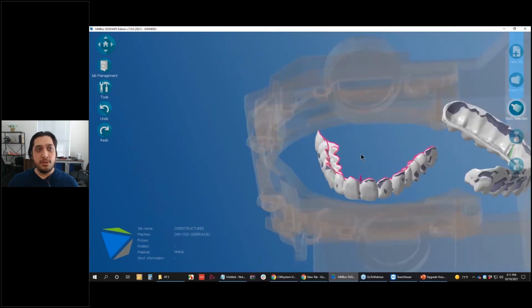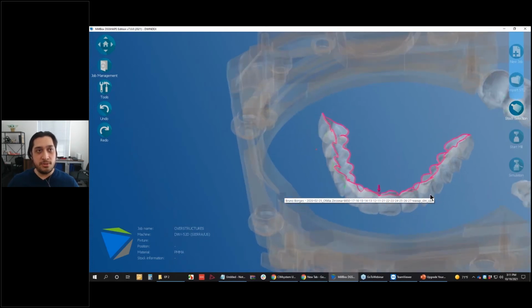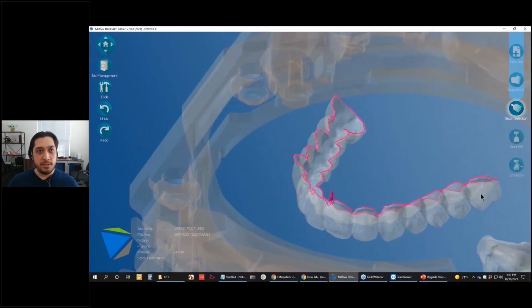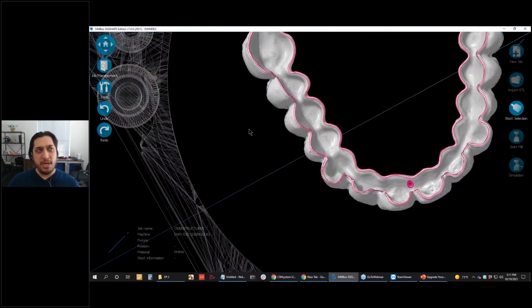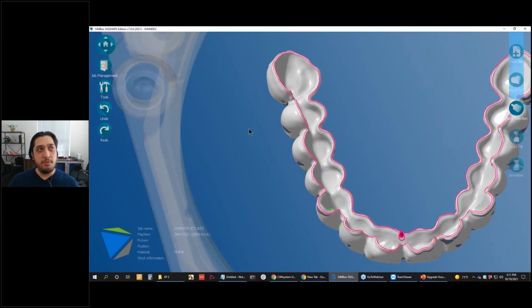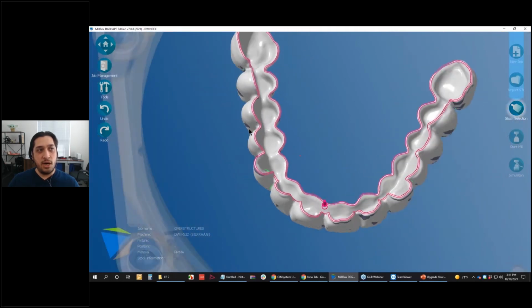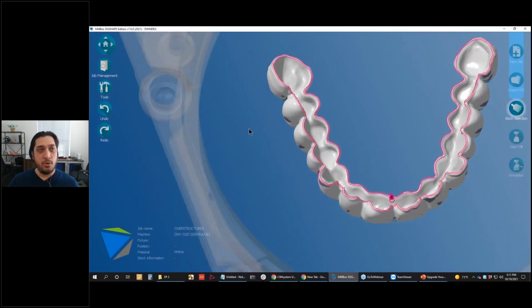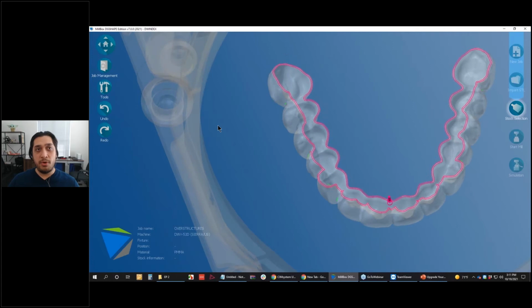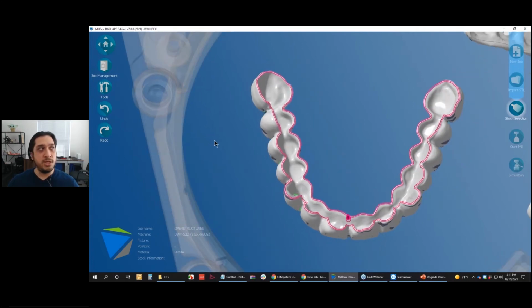In this particular example, on this particular overstructure, I've noticed that there's some additional information that was detected. It looks like there are some drilling axes that might have been detected here. I'm not sure if this originated specifically from the construction info. I'll have to double check that, or if it just detected these and thought they were holes for some reason. Either way, we want to fix that because we don't want the CAM drilling anything there, especially when there's nothing to be drilled.